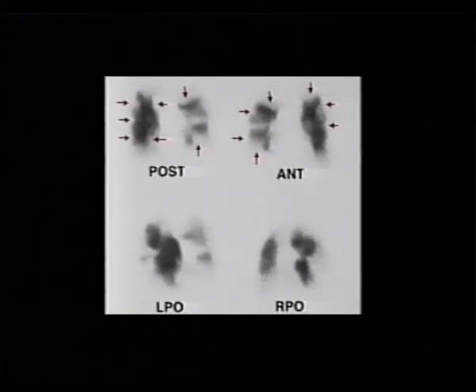This investigation was done to confirm that this is a pulmonary embolism. This is a perfusion lung scan. Multiple filling defects here show that there are multiple infarcts. To confirm that this is due to infarcts, one has to do a ventilation scan and show that these filling defects are well ventilated, but not perfused.